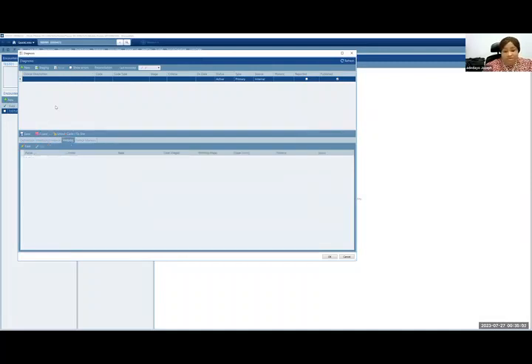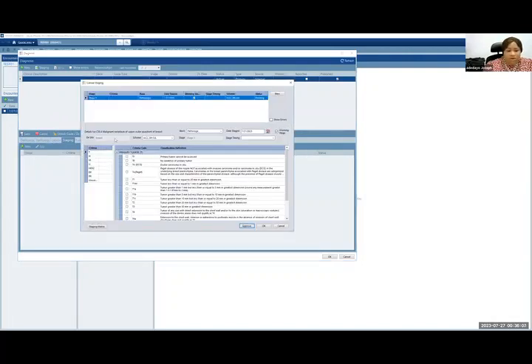And then now to staging, which is the main thing that we wanted to do today. We're going to stage this patient, and I'm going to start from the top. So starting with basis of staging. As we all know, staging can be clinical, it can be pathologic, it can be recurrence. We'll talk about custom when we get to the end of this session. So if we're staging her clinically based on imaging and physical examination, it is clinical. If it is based on mastectomy report, surgical report, then it's pathologic. So in this situation, we're going to say clinical because we're staging on a clinical basis.